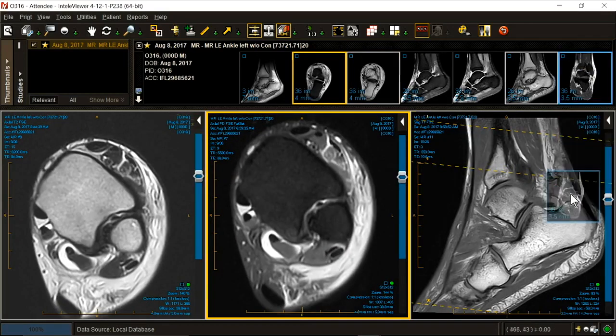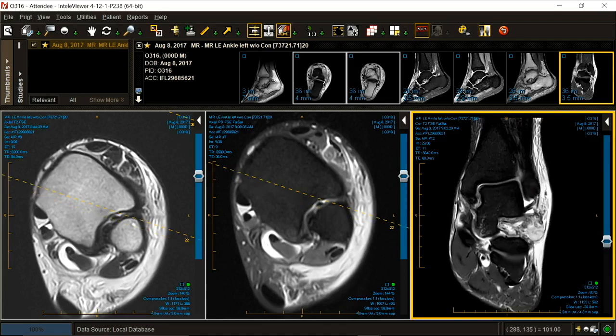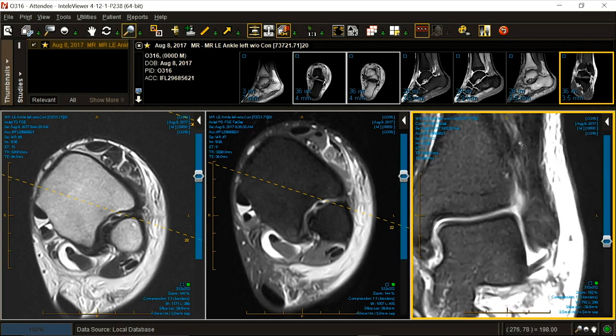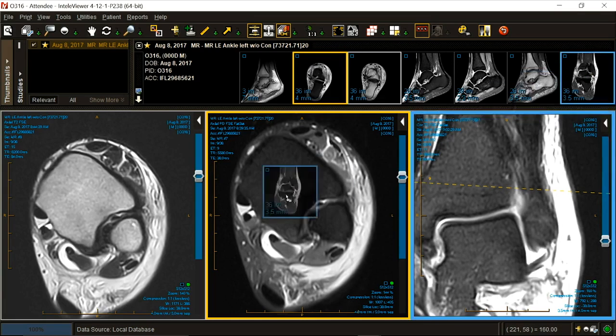Let's pull up our coronal and see if there's any swelling in the interosseous space. Not really. Just a tiny bit down low. Here is the interosseous ligament, right there. Very slightly swollen. No diastasis. Pretty dark. No defect. High ankle, spared. Almost done. Subtalar space, sinus tarsi.